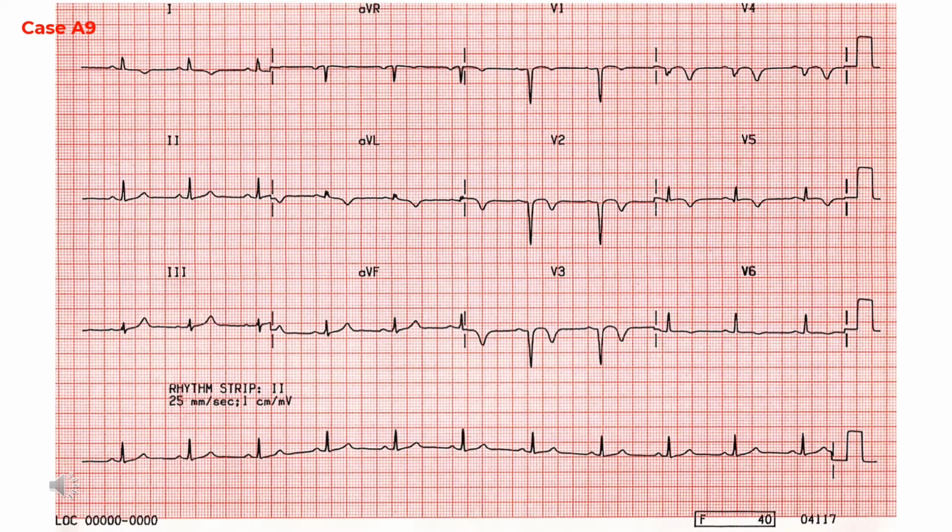The ST segments have returned to the isoelectric line at this stage, although symmetrical T wave inversion is still present in the same leads. In the lateral leads, AVL and V6, the ST segments are downsloping and the T waves are inverted, but there are no pathological Q waves to indicate infarction. The ST T wave changes in these leads are compatible with ischemia in the area adjoining the infarction.